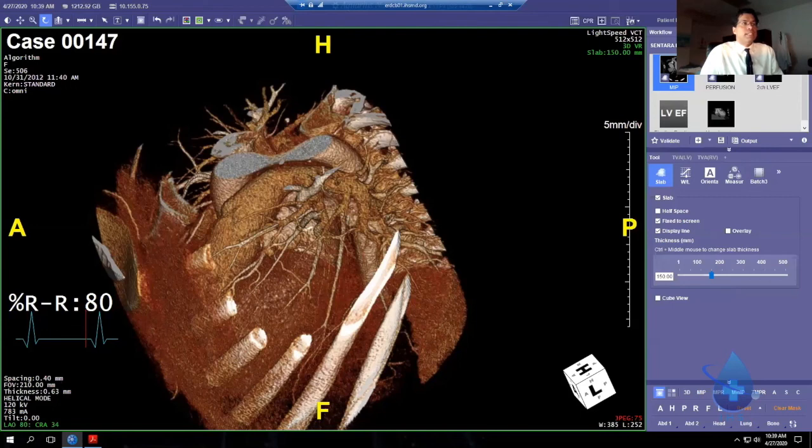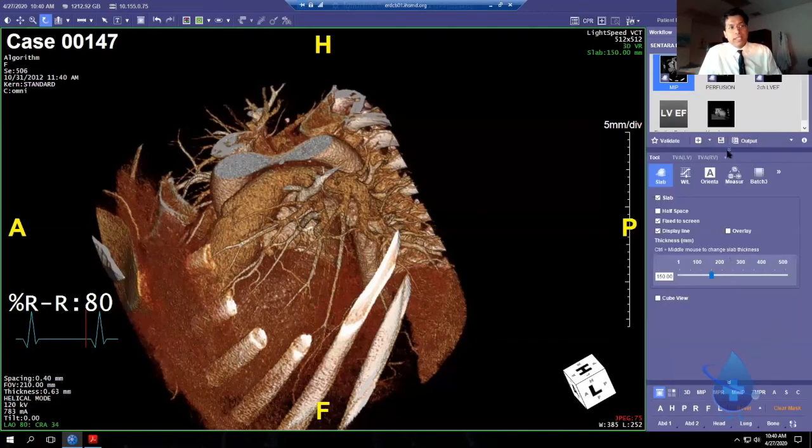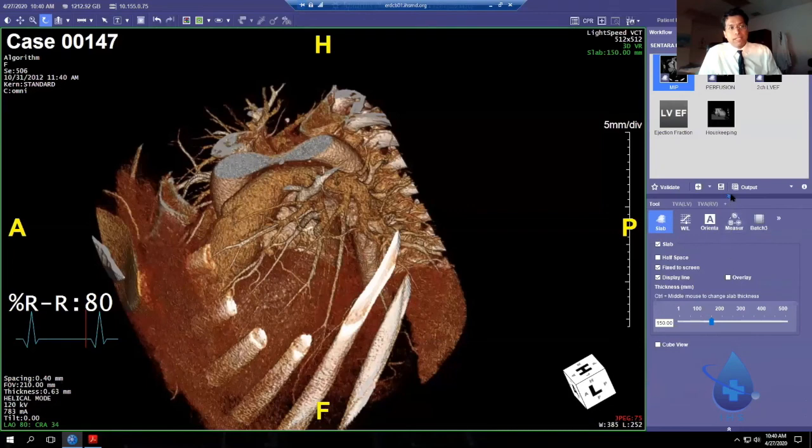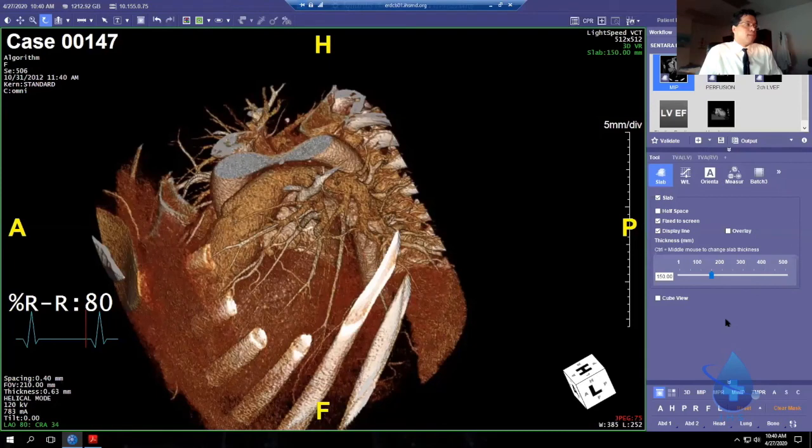Okay. Now, other menus. There are a series of menus that go up and down the screen here. So this menu collapses and gets enlarged by clicking this little arrow. This menu collapses and gets enlarged by clicking this little arrow coming up and down the screen. The next most important button is the phase window. So that's these 2 little buttons here below the time.